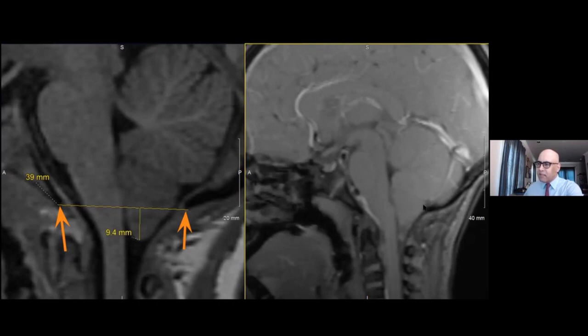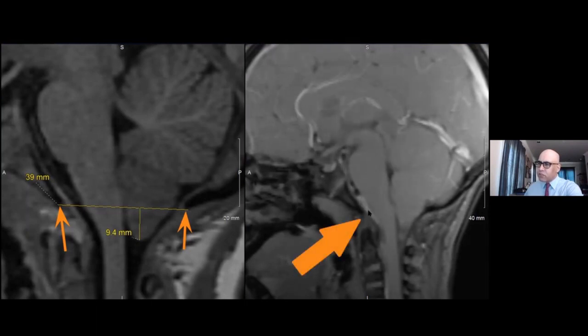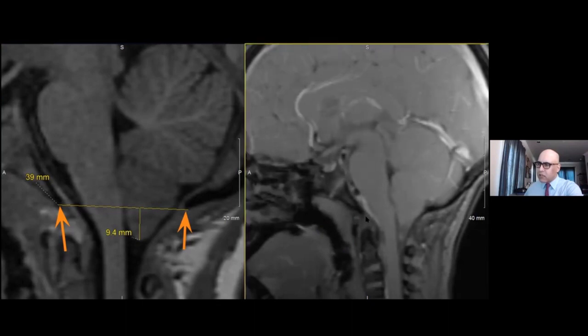We can see the basic anatomic details that we see in the structural image. And as we scroll through the cine, we can see different phases of CSF pulsations. And we can see here the brainstem, the upper cervical cord. And so this is the cervicomedullary junction. And we can see that ventral to the brainstem and cervicomedullary junction, we have patent bidirectional flow of cerebrospinal fluid. We can see it going from dark to bright. So that is showing two different directions of flow.